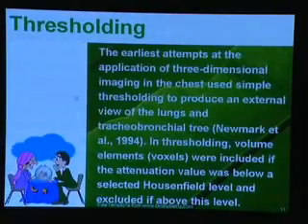Thresholding is the method by which we do this through segmentation. By thresholding, we can make maximum appearance within a specified threshold range. How can we use this?